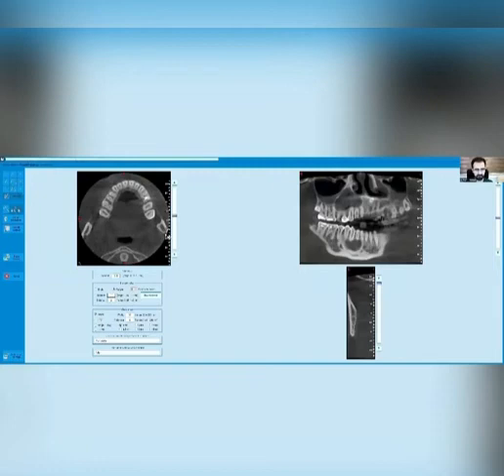Just click on it, and then scroll down as the canal shows up towards the anterior part, towards the mental foramen. Scroll down a bit. As you see the canal goes on, it's just like an encircled shape. You can visualize the canal as you go on to the anterior part, up to the mental foramen. See the canal here? Just don't miss any section. Click on it.